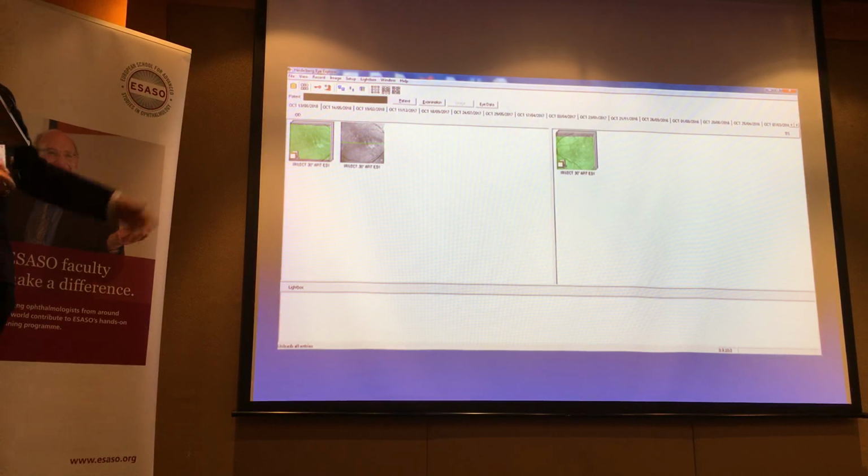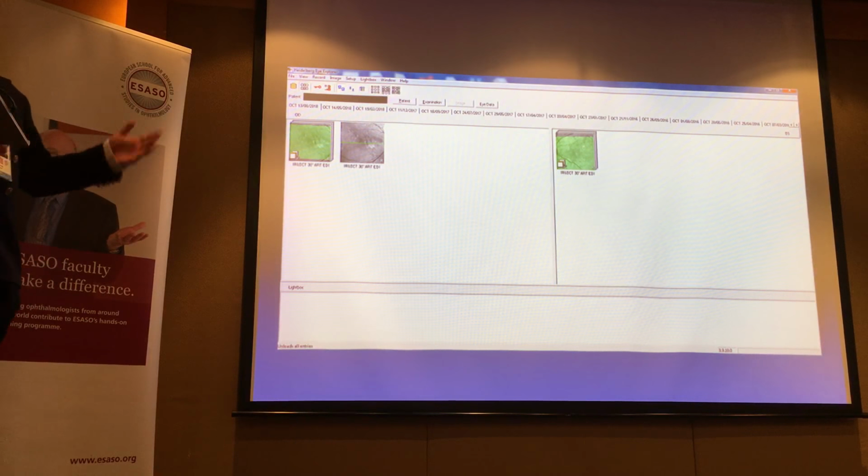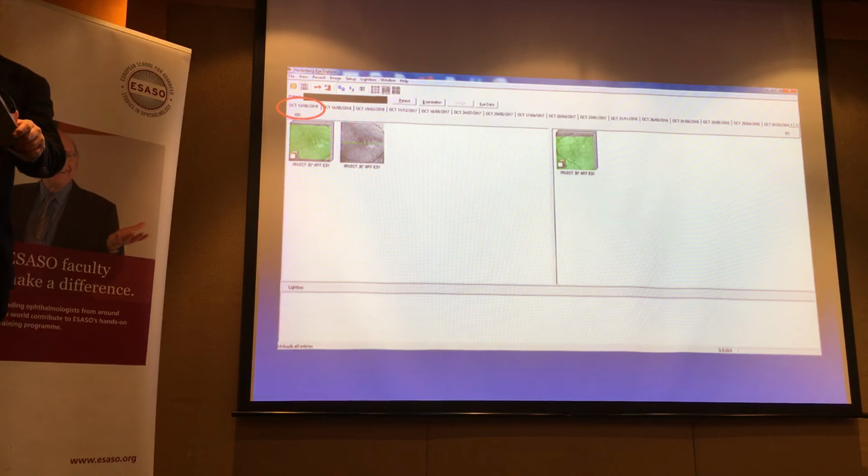imagine she's here today. So she comes in, right? And you view her on the computer monitor. So what will you do? You just double click here, and then you open it and you assess. And well, let's look at this. The words may be a bit small, but trust me, it says 13th of August, which is obviously not today. Well, granted, it was about 1 or 2 weeks ago, but I think it illustrates the point.